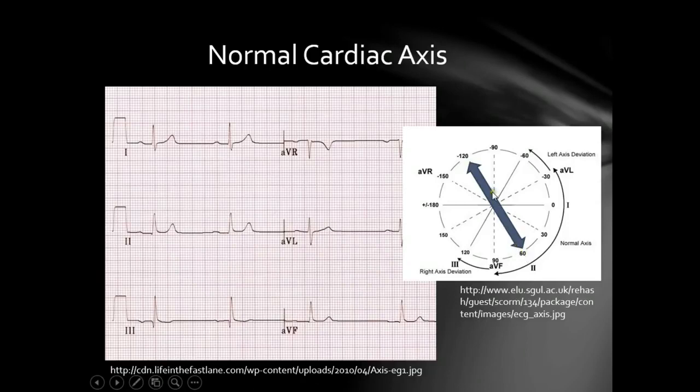And to know to which direction it is pointing, we have to look at some of the other leads. So, for example, you can see here that leads 1, 2, 3, and AVF are all positive.